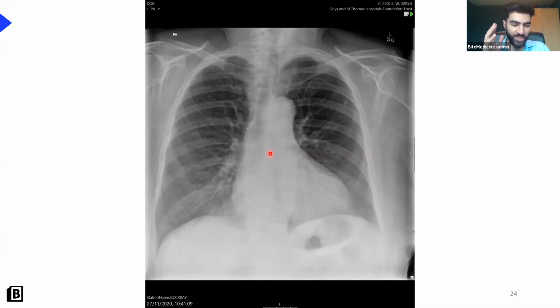So remember, chest x-rays are really difficult. So don't worry if you're struggling. X-rays are the most difficult imaging modality to interpret. So this is normal, okay? You could argue there's one slight abnormality in this film, and the sharp-eyed amongst you might have noticed there's a PICC line running into the heart over here. Very subtle. But otherwise, the lungs themselves and the rest of the x-ray is completely normal.